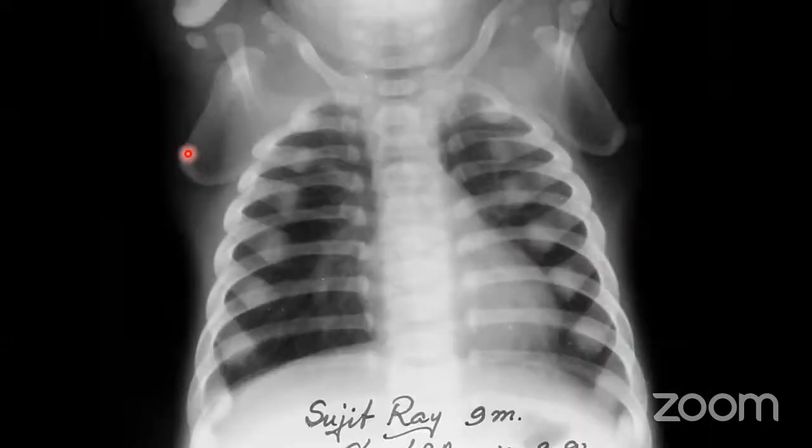Again, bones. If you look carefully, the anterior ends of the ribs are much wider. The child came with obtundation. On inquiry, we came to know that this child's father was producing large batteries, and the battery contains lead. By 9 months the child started crawling, and he used to chew all these leftover batteries.